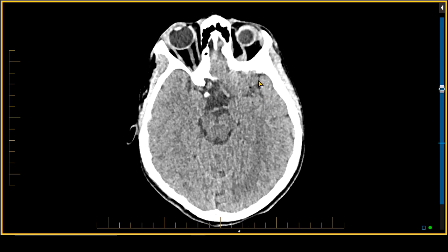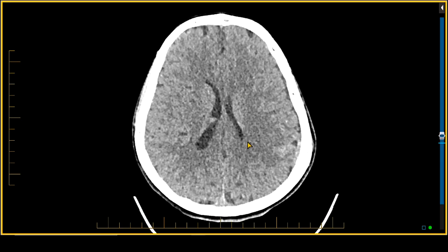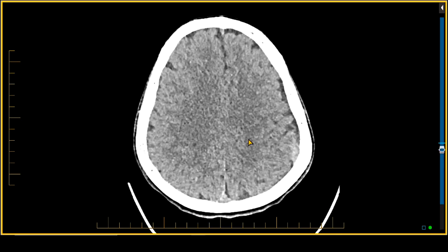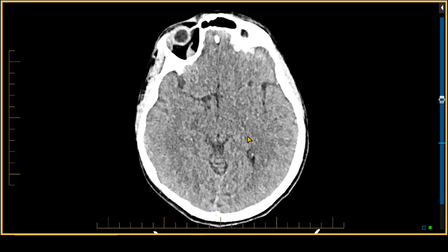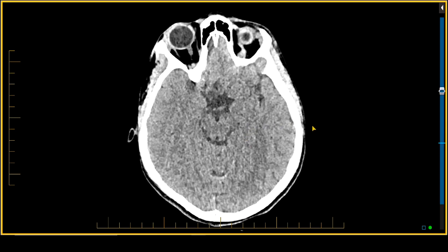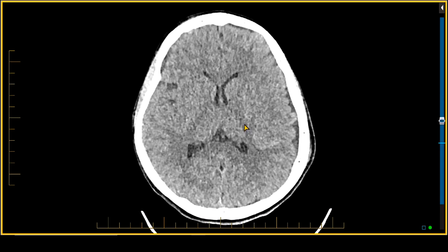So the patient will likely get serial scanning, and you're kind of unimpressed with the degree of the pathology, even on the thin section images. At this juncture, if there is a discordance between the neurologic examination and the CT scan, generally the clinicians will repeat the scanning at the 6-hour mark with CT. However, particularly in children where they don't want to do serial CT scanning, they may proceed to get an MRI scan. Let's see what happens to this individual.